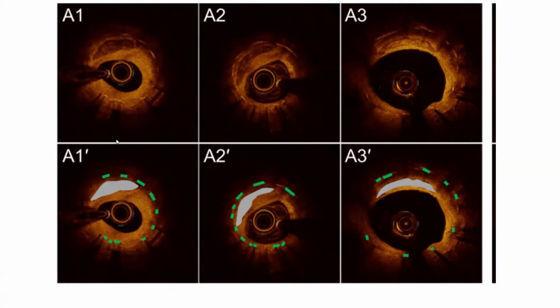And those are images from the literature of calcified neoatherosclerosis. This dark, well-demarcated area on OCT is the calcium. It's inside the stent. This is the stent here, and the calcium is inside the stent. The rest of it, the bright yellow here, is non-calcified neoatheroma. This is another image here. This is the neoatheroma, the yellow. This is the calcified portion of the neoatheroma.